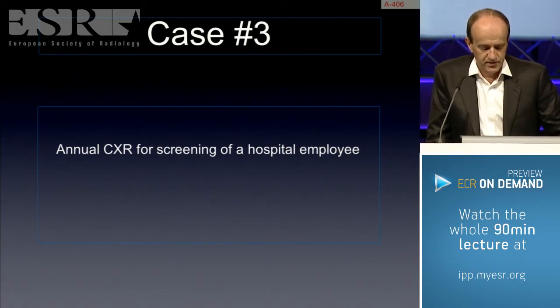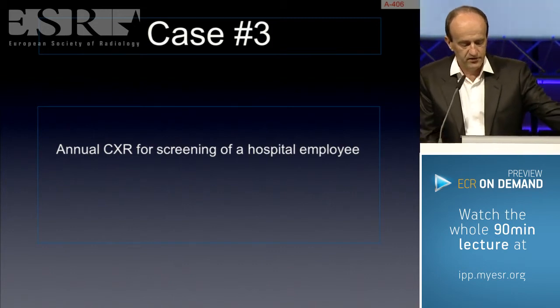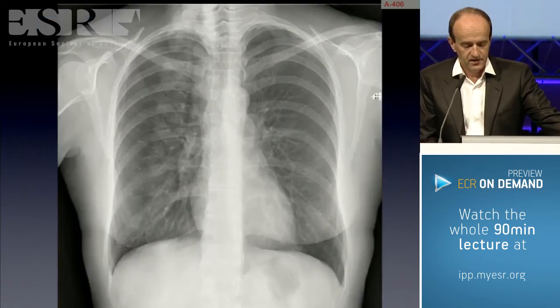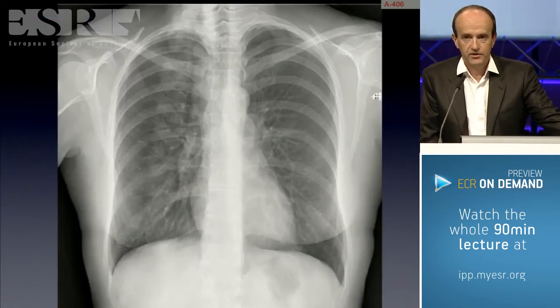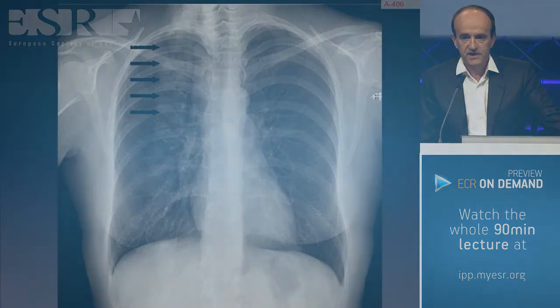Now we have case 3 with a hospital employee undergoing a chest radiograph for screening. This is the radiograph. Most of you have seen this.